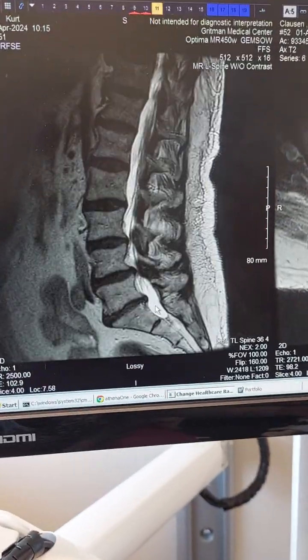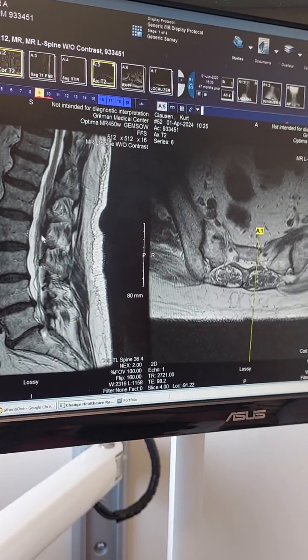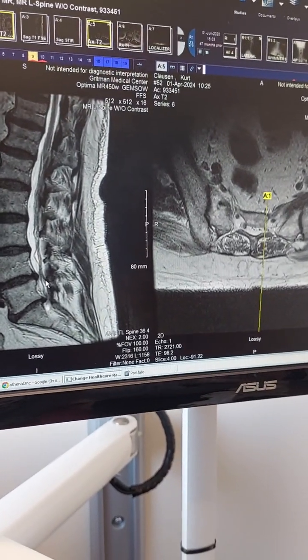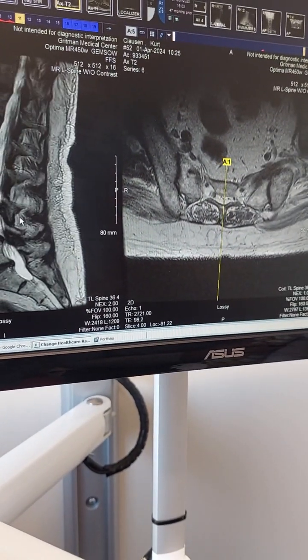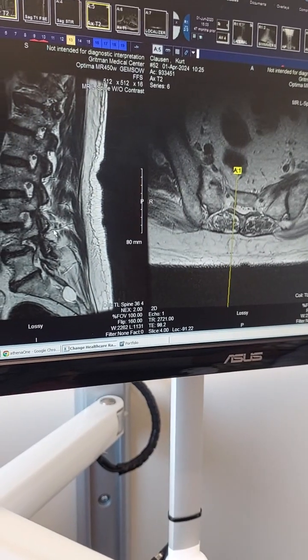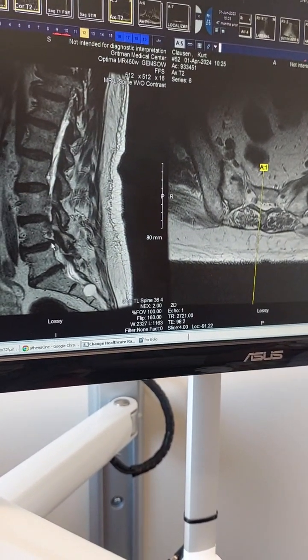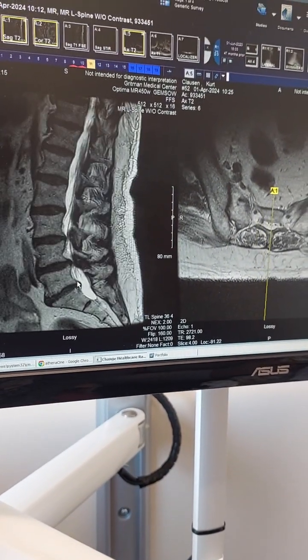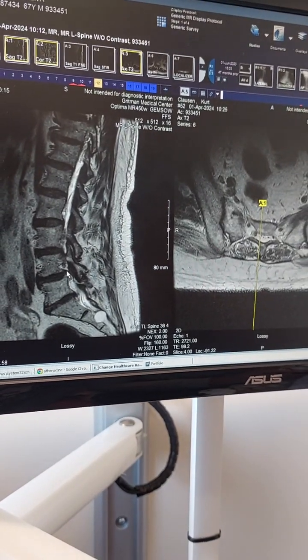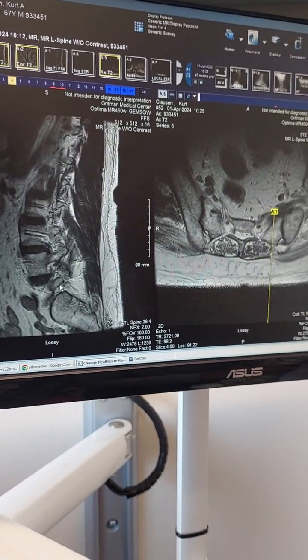So you've got bulges that are in contact with nerve roots, causing central stenosis, an hourglass effect in the central canal. And it's also causing foraminal stenosis, the little keyhole openings, because disc is occupying space. It's causing foraminal stenosis at those levels as well, and that's happening at L3-4, L4-5, and L5-S1.